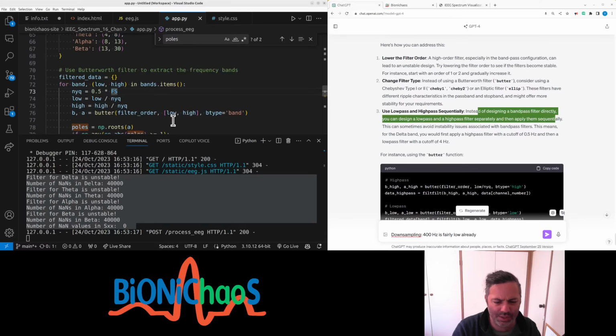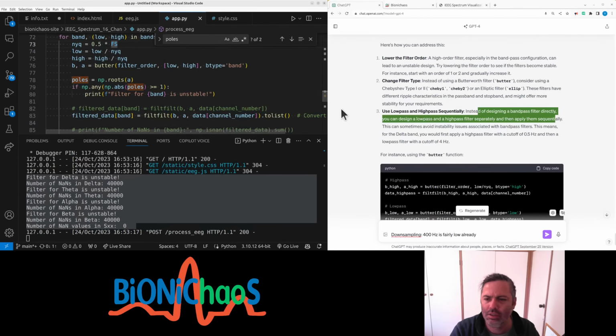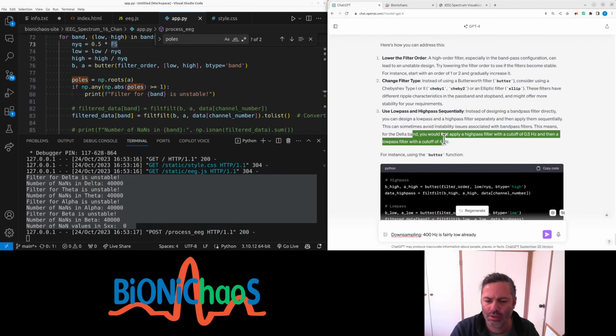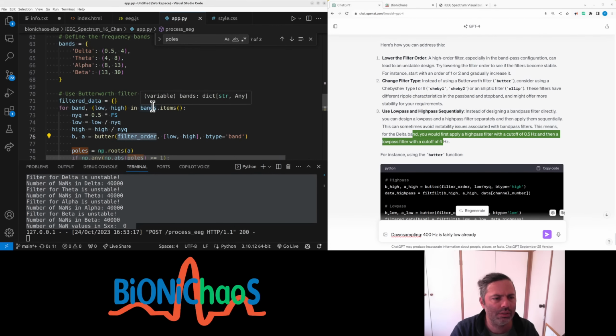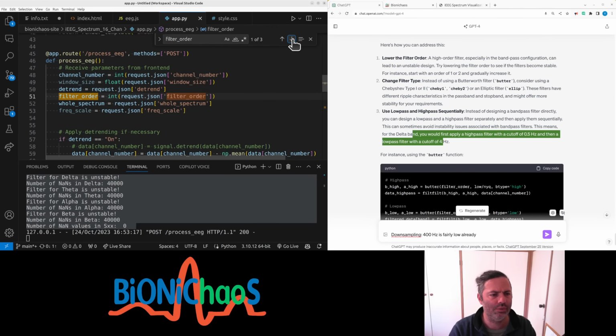What are we currently using? So it should have given a default filter order. What is the filter order?